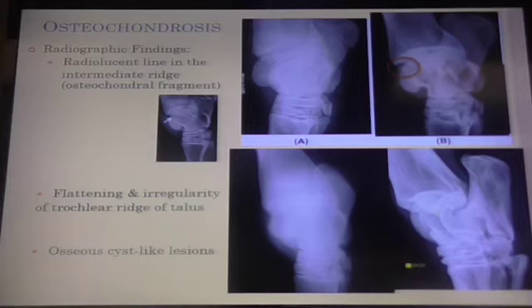What'd you all say? So some of you are saying, okay, notice these are the same. You see these views right here? They're going to be the same one. I mean, how many ways can you ask? Which view is this? They all kind of look alike. So then, whose nose is this? And which trochlear ridge is that? So smart. Okay.